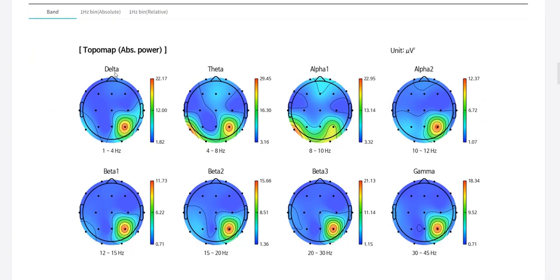Another common type of artifact is going to be eye movement. You'll usually see that in the delta and theta bands right near the front of the head, or beta bands if it's more of a twitch or more extreme eye movement cases. And the last component that you may often find is EMG, basically muscle artifact through a tense neck, tense jaw, or tension in the forehead. Basically, any muscle is going to be a lot louder than EEG and will get picked up by the system.